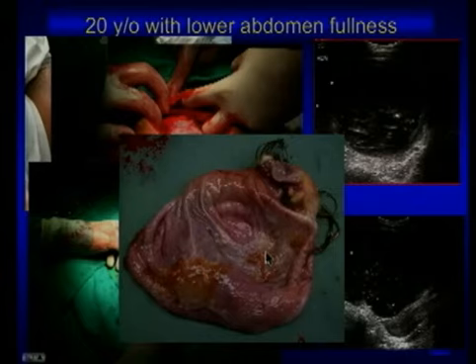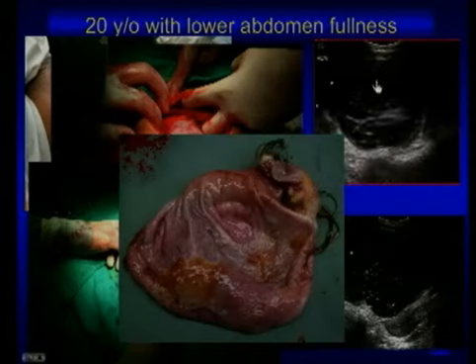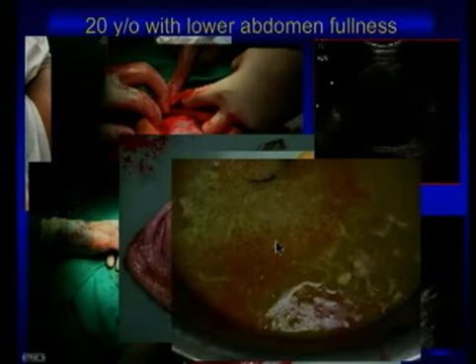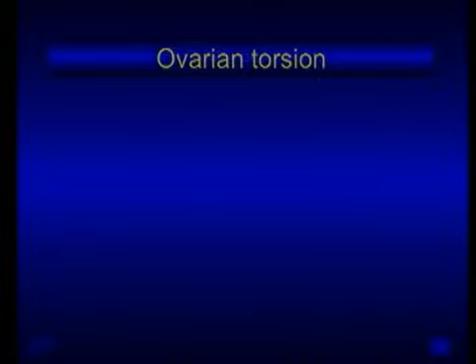This big mass that we see over here with dense shadowing, was this a fatty mass or was it bone? And in fact, it was a big fatty mass with hair. And finally, the rest of it was like a soupy fluid collection of fat. So very typical features of an ovarian dermoid that can also present with pelvic pain or pain and a mass.